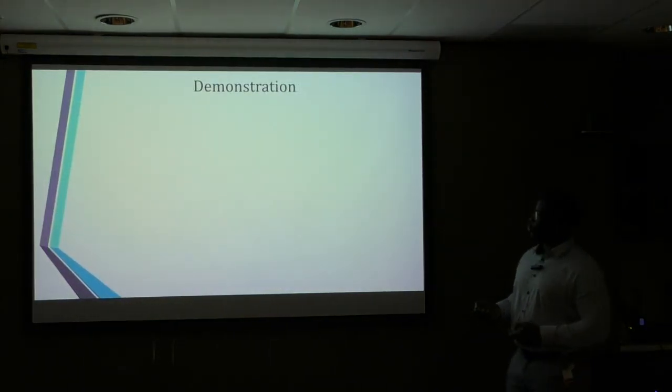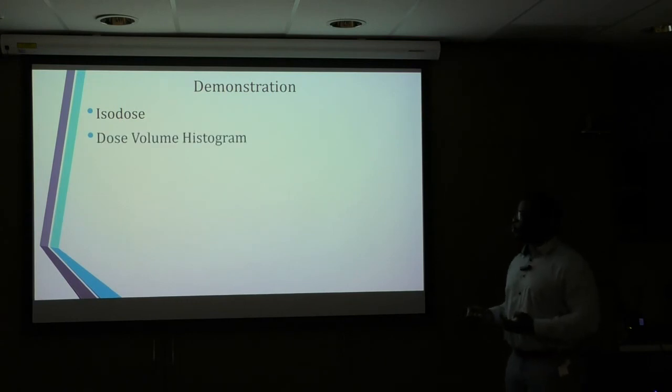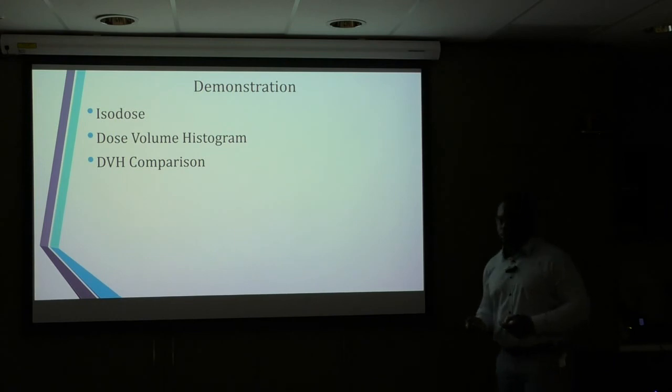So now I'm going to go into a demonstration and show you the isodose module, dose volume histogram module, and the dose volume comparison module.